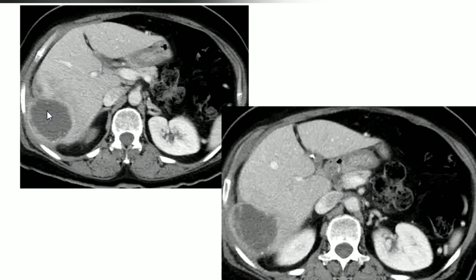This is most probably slipped calculi during surgery resulting in liver abscess. Okay, ma'am. Thank you. Ma'am, is there anything in the IVC as well? No, it's just improper mixing of contrast, related to the timing of the scan.